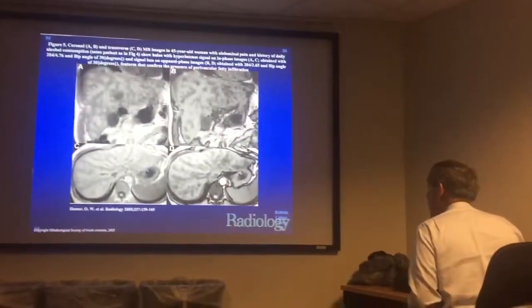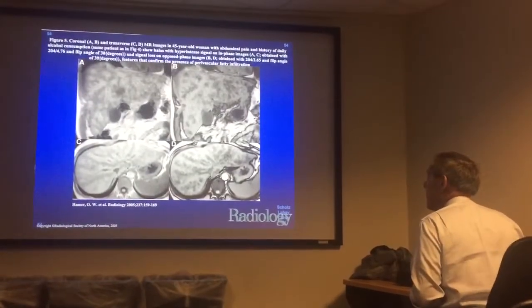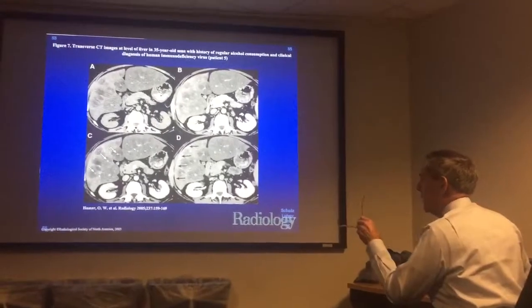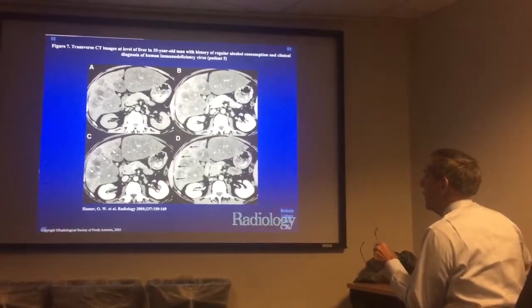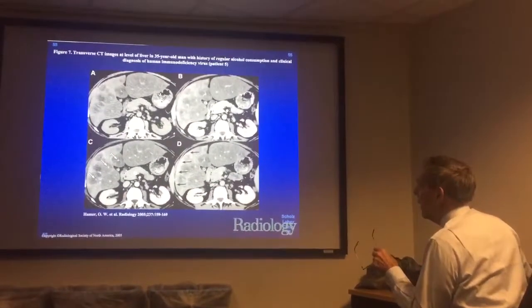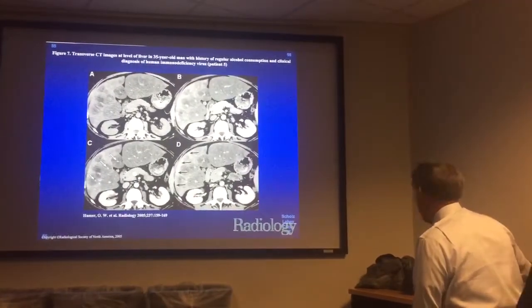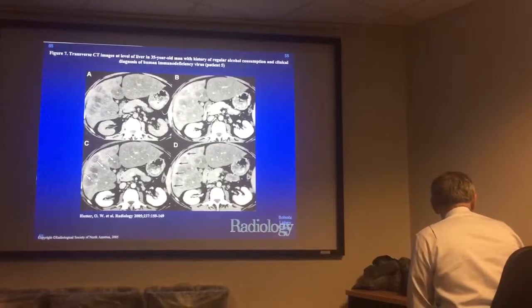I studied my buns off, and they didn't ask me too much difficult material. So these are all examples from the literature on the perivascular form. And you notice it can be asymmetric, lobar. There's a lot of things we do not yet understand, and that's for your generation to work out.